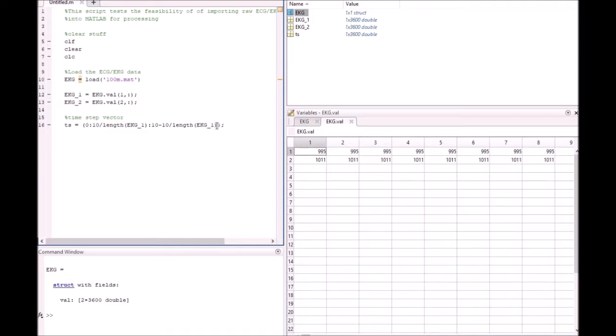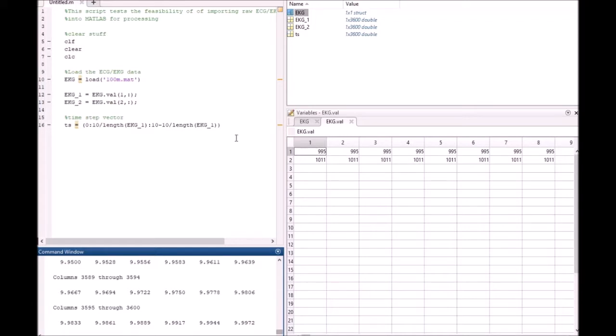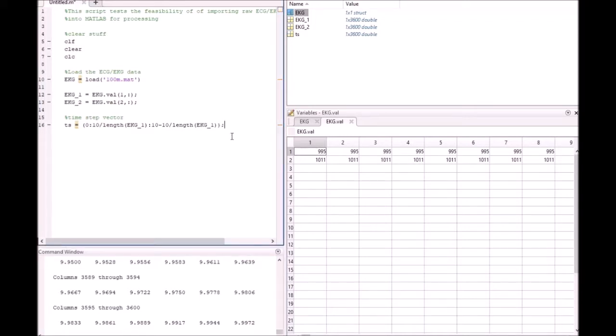If I take this out and just make it 10, the max is 10 seconds, right? What ends up happening is 3601, see? So you have to have that. Control Z that. That's what you want to do. And watch this, if I leave this open, this is what happens. It's just printing all of the data, all the time steps. So I'm actually going to suppress that output.